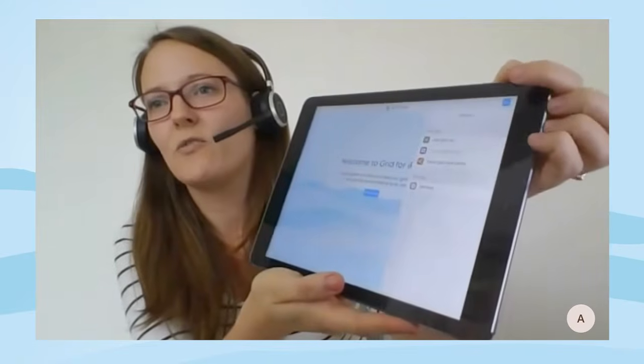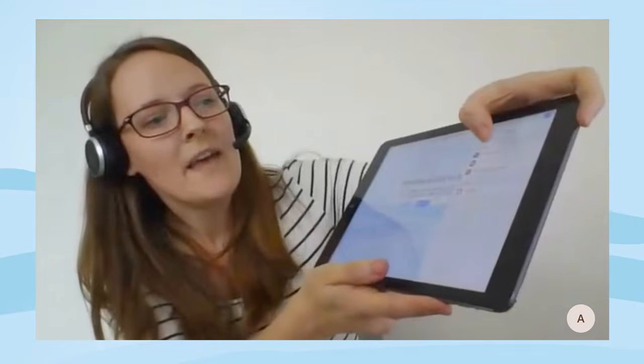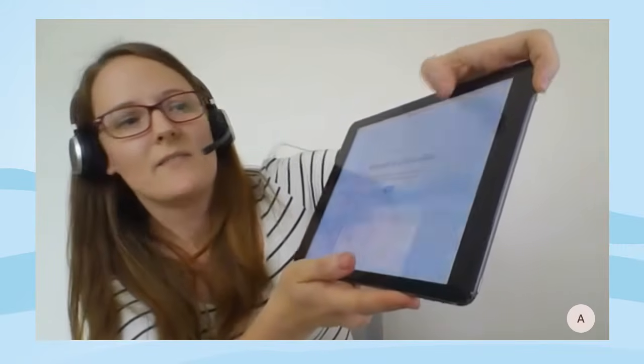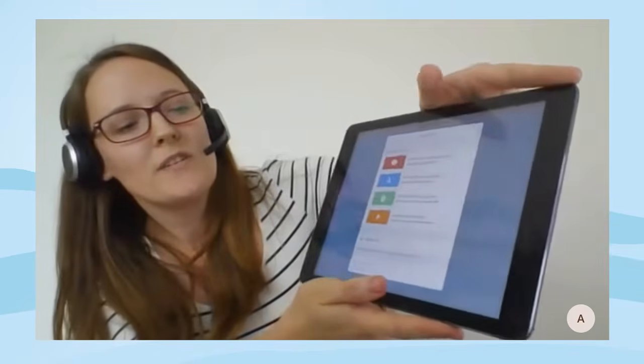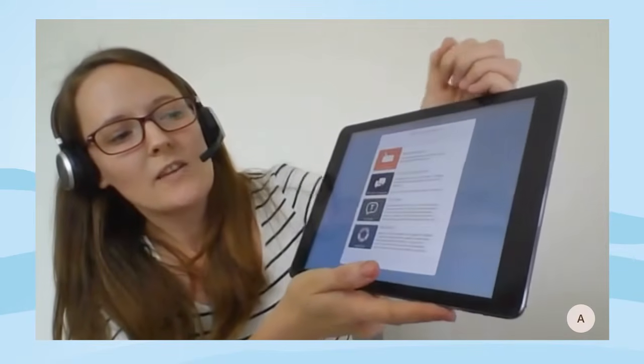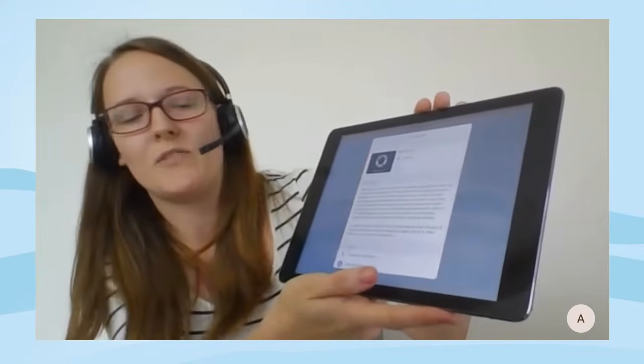You just tap in the corner on the little 3 dots to bring up your menu, and then choose Add Grid Sets, which will just load up the different options. Choose Text Communication, and then you'll see the AlphaCore grid set at the bottom there, and you can choose to add it in to try it out. So feel free to do that if you're wanting to have a look at the grid set as we're going along. You can try that out, as I say, for free.